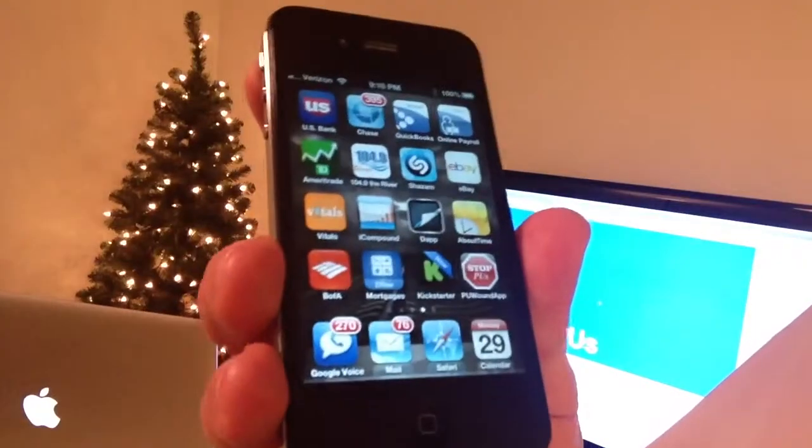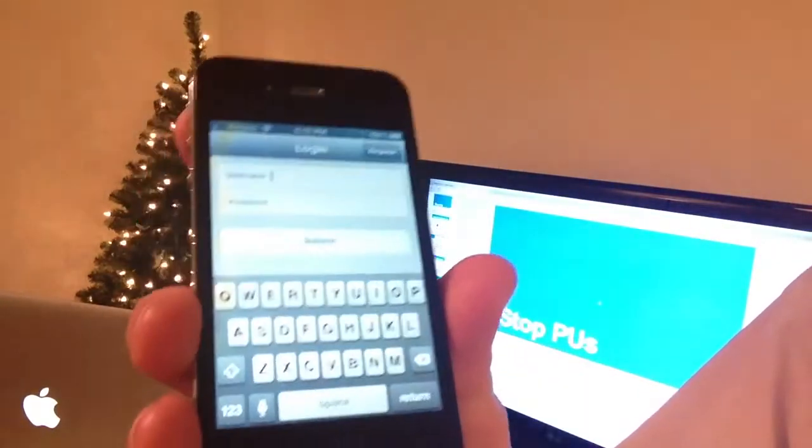So first of all, the iPhone app was developed such that it requires a login for nurses. So we're going to go ahead and log into the application as a test nurse. And we're going to see the patients that are already available to this nurse.